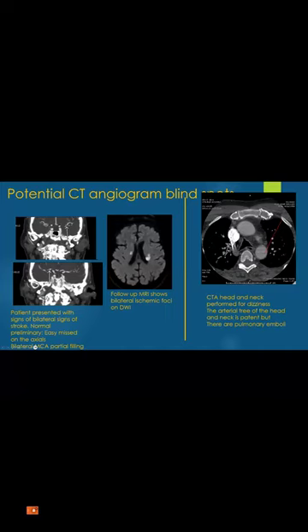Stenosis. Filling defect, actually, not stenosis. This is a filling defect, here. And in this patient, there is pulmonary embolus. The patient had dizziness and diaphoresis and came for an angiogram. Everything in the angiogram is fine, but just look at the lower cuts of the angiogram. You might be able to detect pulmonary embolism.